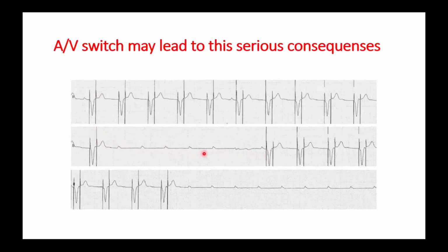This is a very, very common question in the EHRA exam. Exactly. So this is an important thing that we should look for after implanting a dual chamber pacemaker, as it can lead to a disaster as happening here.